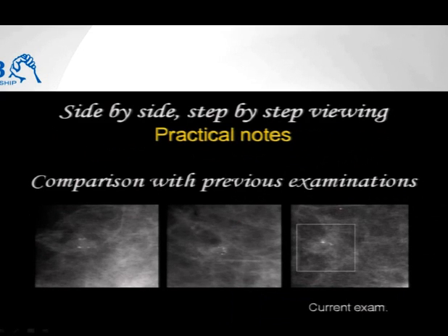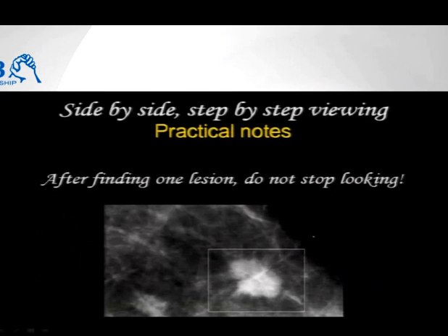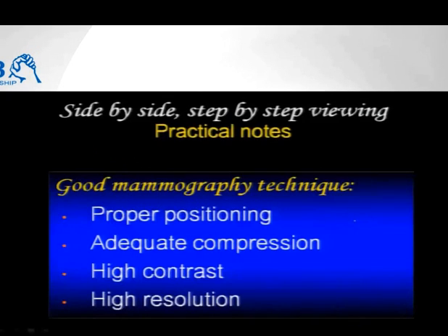Very important message. Don't compare today's mammogram with yesterday's mammogram, but the next to last. Then you are going to be able to perceive the change. And don't ever forget that after having found one lesion, don't stop looking. There may be another one. Multifocality is very frequent. Actually, only 40% of the cancers, breast cancers, are unifocal.